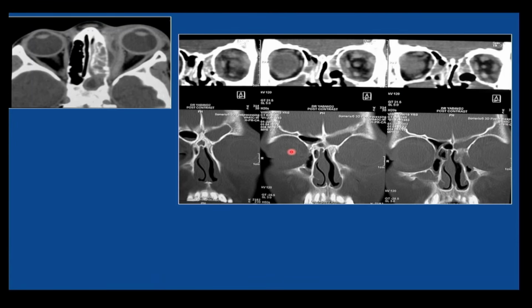So, I told you I am not going to show you sinusitis. Acute sinusitis, nobody investigates. This is a companion case. These are two different cases. There is opacification of the ethmoid as well as the sphenoid. And what do you see? You see a complication, correct? Sorry, I didn't hear. Okay, so this is a subperiosteal abscess which is extraconal, causing mass effect.